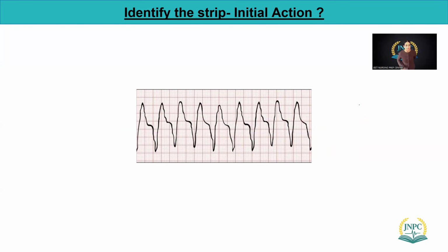It's the last one. Tombstones. Even though there is a notch on top, it's ventricular tachycardia, VTAC. So that's it, guys.